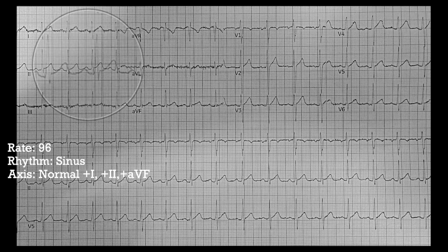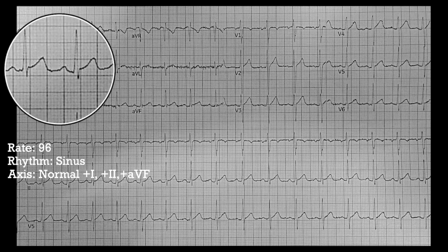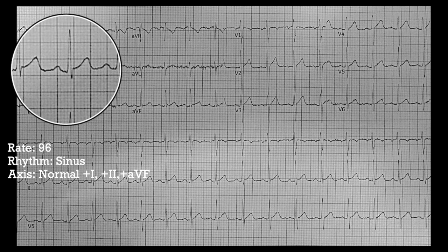And so let's see if that's the case in this EKG. It looks like, again, here we are. P wave kind of starts there, about this little line right before the thick line. And does it finish and the QRS complex starts?